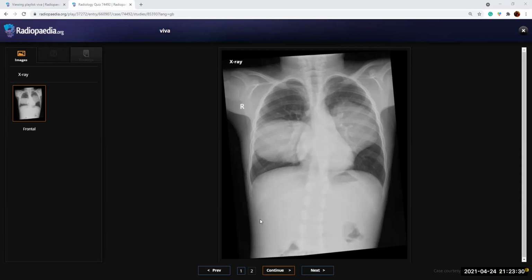Okay, what other complicating features can you expect to see in these cysts? Complications? There can be a communication with the bronchial tree, and the patient can cough out the contents of the hydatid cyst. There can be diaphragmatic and other complications, like it can communicate with the abdomen and other organs, mainly the bronchial communication. So what will we look for that?